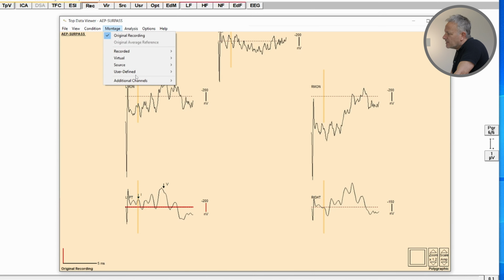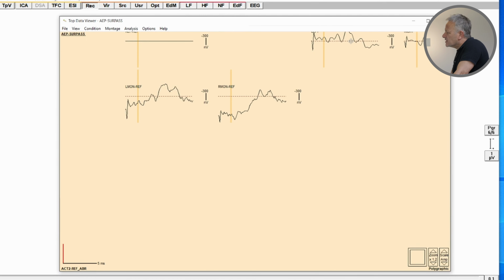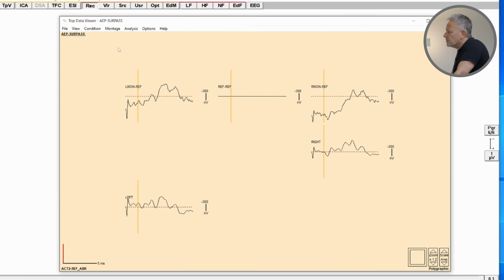Let's just make sure that let's put the reference again to where they should be. They moved the channels now. That's because we didn't save it as that. So let's just move them back here so we can quickly see. So right again goes over here, and the right channel goes on top, the left, we just move down here again. Let's put that back here. So let's beautifully save that.